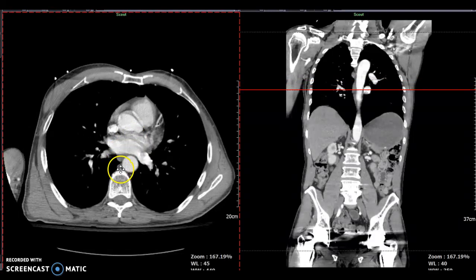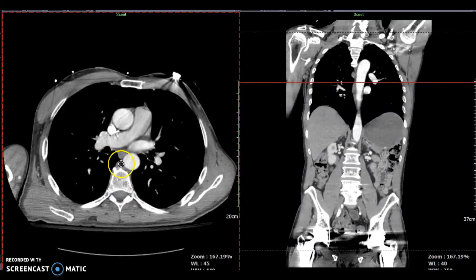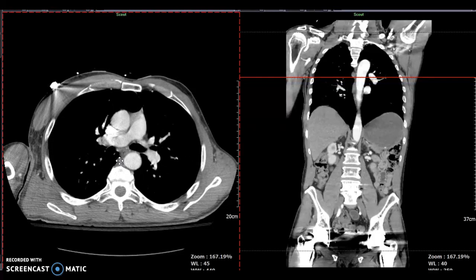Interesting thing, what you also need to know is this here. This is a nice shot of the azygous vein. This is the alternate route if the vena cavas are obstructed for blood flow. So let's go ahead and follow this. It's supposed to empty into the vena cava. In this case, I'm going superior, so you're going to see this empty into the superior vena cava.